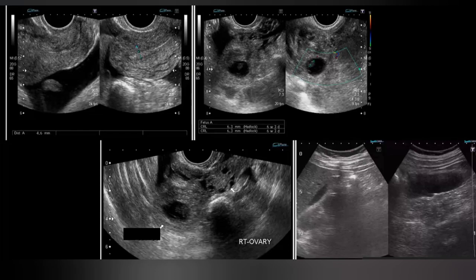In either case, you have to inform whenever there is an ectopic pregnancy, but again, this is too much of an emergency because the patient will collapse due to the intense hemorrhage within the body.